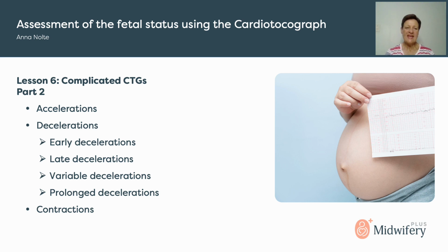Very welcome again to assessment of the fetal status using the cardiotocograph, and you have now progressed up to lesson 6, and we're going to do part 2 today, where we will do the accelerations, the different kinds of decelerations, and the different abnormalities regarding the contractions.